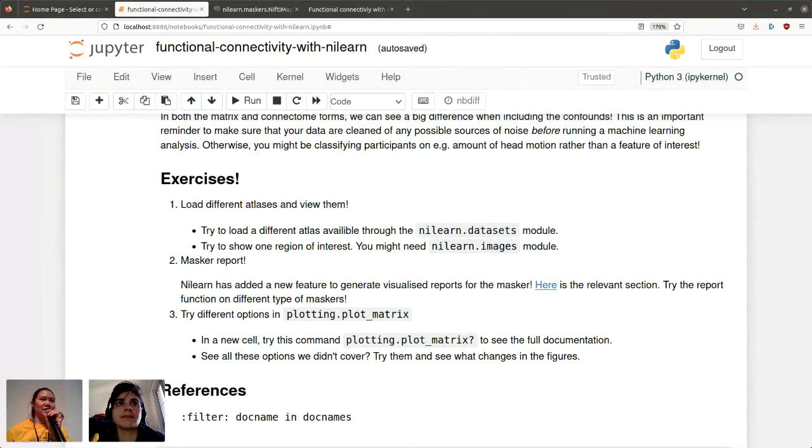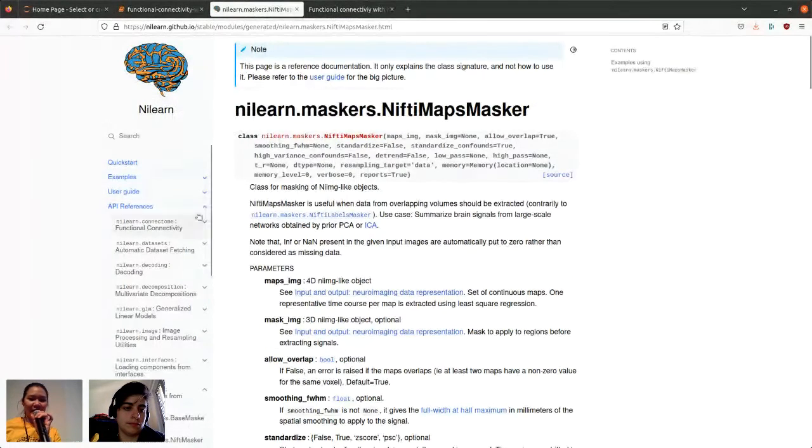And if you want to understand how those related functions work exactly in Nilearn, I will direct you to the explanations we have provided in the documentation of the load confounds function. I hope that answers the question. And maybe, Yasmin, you can pull up the API.